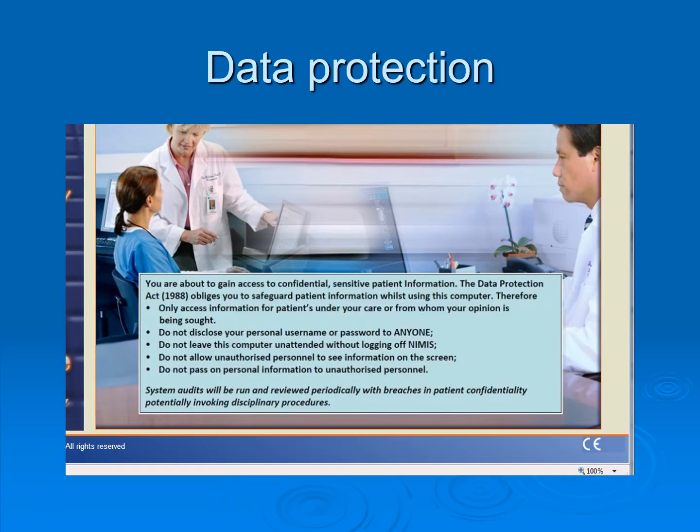NIMIS is a national system. All HSE staff are obliged under the Data Protection Act to safeguard patient information. When you log into RIS, the front screen displays this message. It reminds you of your obligation under the Data Protection Act to safeguard patient information. Please take a few minutes to read this message when you first log in.